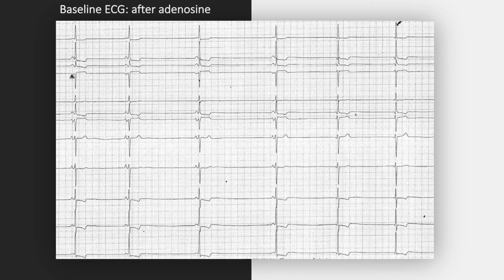The explanation for this is the following. During normal sinus rhythm, there is a parallel activation of the AV node and the accessory pathway, resulting in minimal pre-excitation and loss of septal Q wave in the left lateral leads. During AV junctional rhythm, ventricular activation propagates antegradely over the His-Purkinje system with activation of the interventricular septum in a left to right direction via the left bundle branch, which produces the septal Q wave.